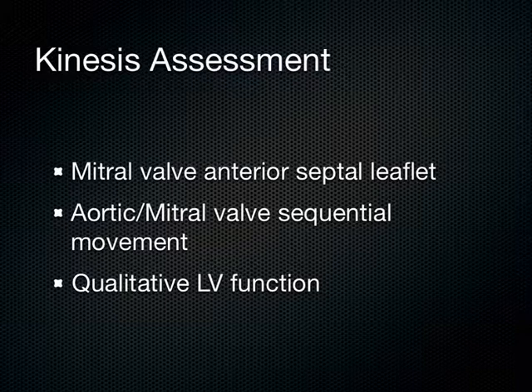We're going to finish this lecture off with kinesis. I've got a patient who's hypotensive. Do I give them fluids or pressors? That's kind of like my first branch point in my head when I've got a patient with hypotension. And I can help that branch point one way or the other using this kinesis assessment.